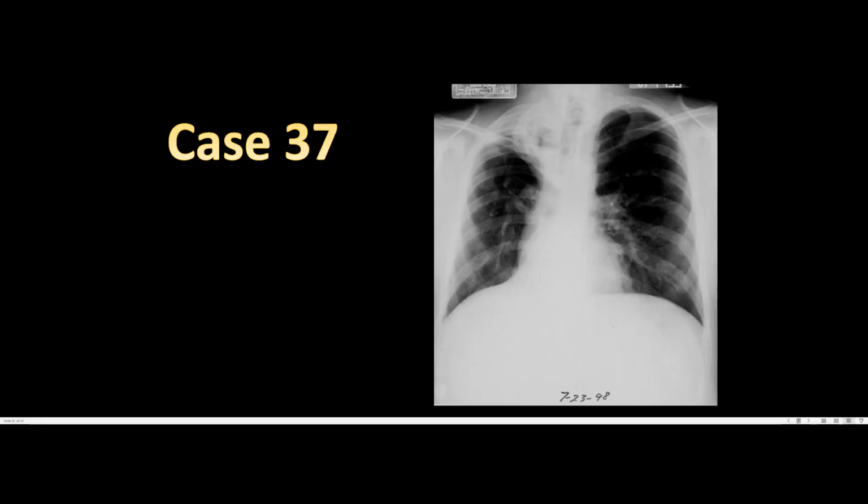And if we look at this one, this is almost interesting. But if you notice, there is the presence of practically fibrosis. So everything looks relatively normal here, although it's not as clear. I mean, it came from 98. But if we go up towards the right lung field, we can notice an area of opacification right at the apical surface, or practically at the apical right upper lobe.